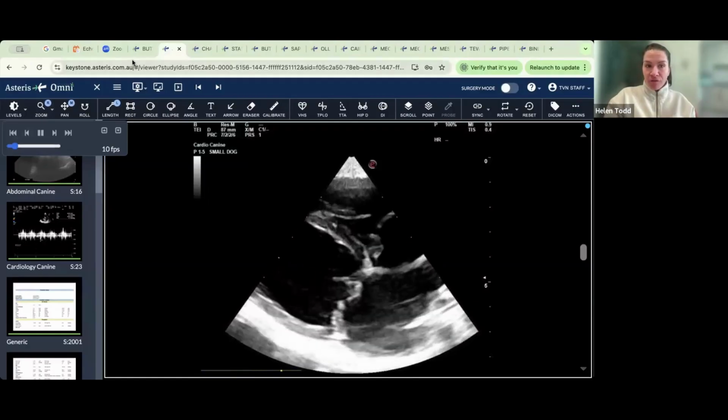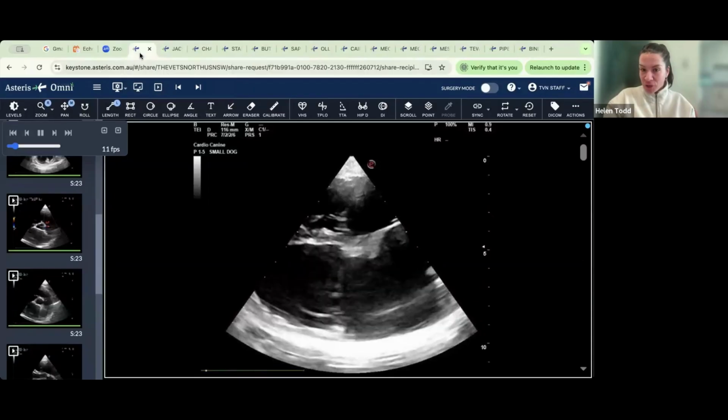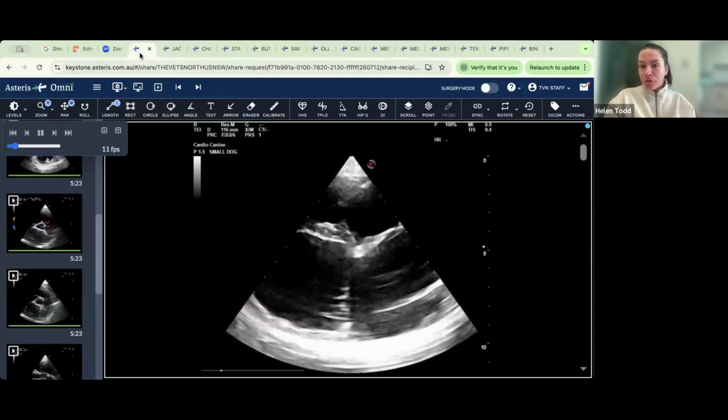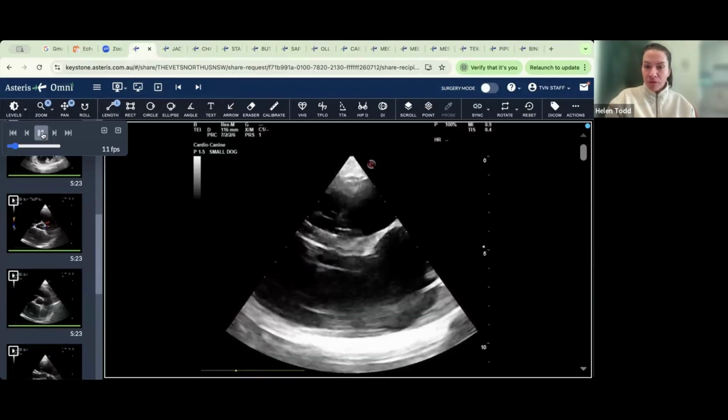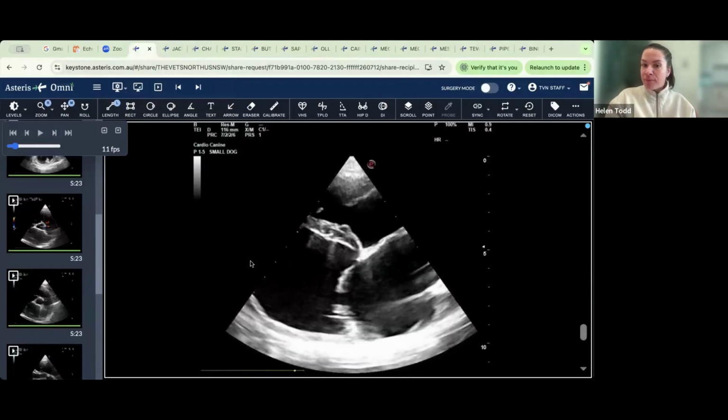The mitral valve leaflets are really thickened. So if I go back to this cine loop, can you see that beautiful thin line of the mitral valve? They're never completely straight, but look at this beautiful thin line of this septal leaflet. I'm going to refer to this leaflet here as the septal leaflet that goes up and hugs the septum up here.